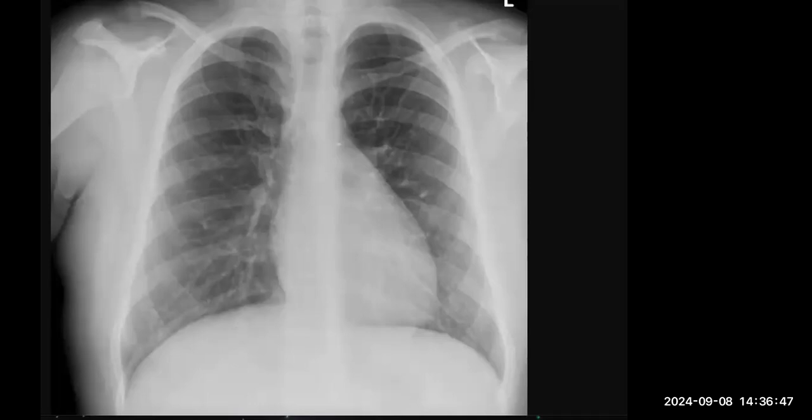Okay, I've started your timer. I'm presented with a chest radiograph of a mature skeleton. I'm looking for any obvious abnormality, which I'm not able to appreciate. I'm going systematically. I'm looking for any pneumothorax, which I'm not able to appreciate.